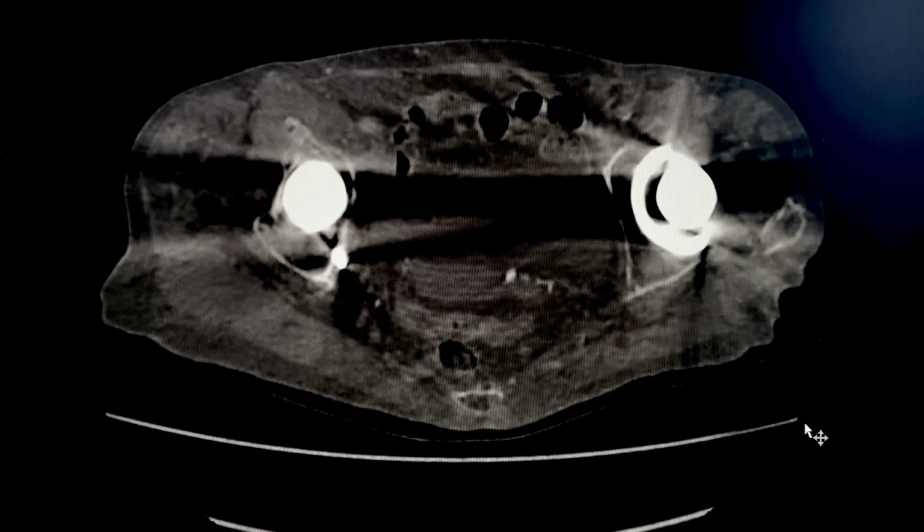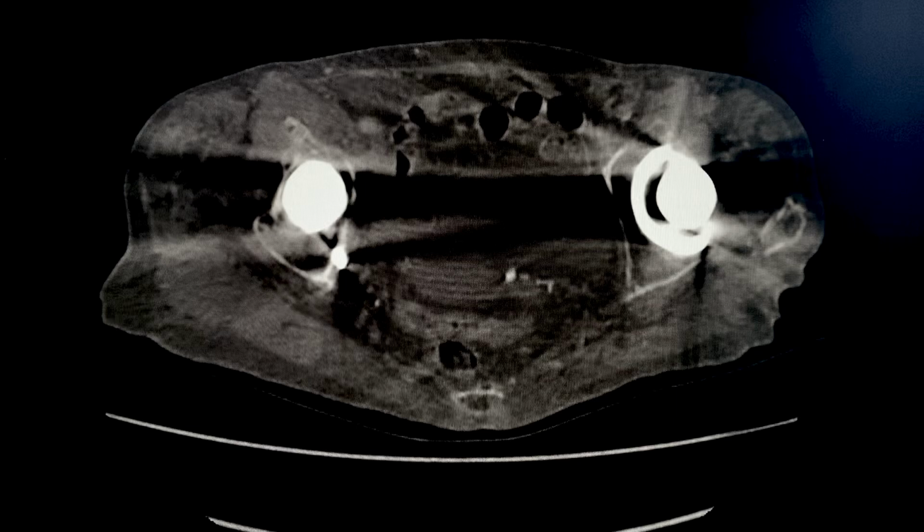The patient presented with pulselessness on both legs, especially in the inguinal area, the femoral region, with thigh pain and pain in the muscles of the lower leg. We did a CT scan. We also did an ultrasound, and this was the result of the CT scan.